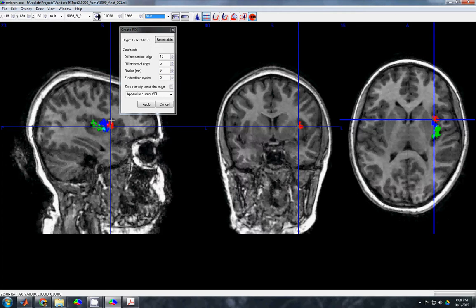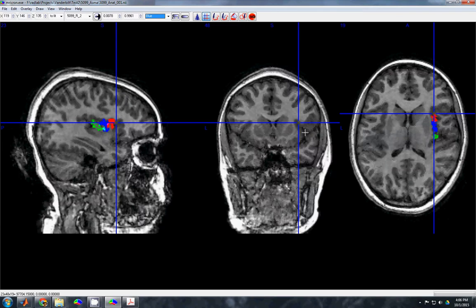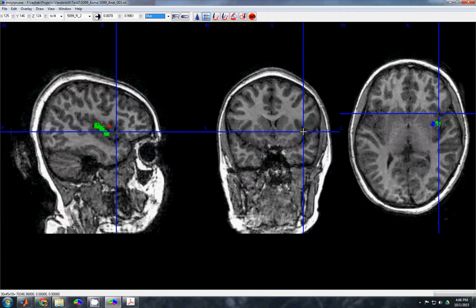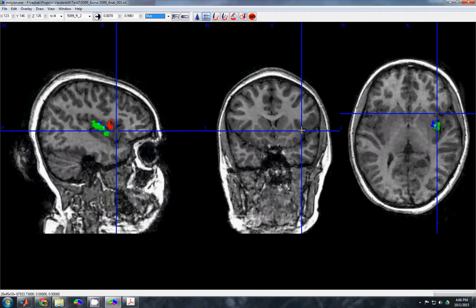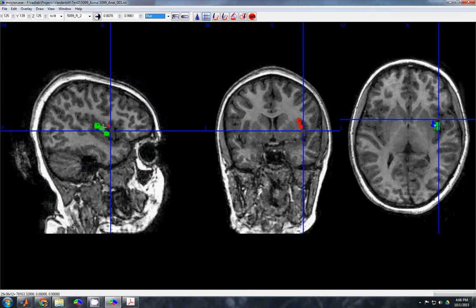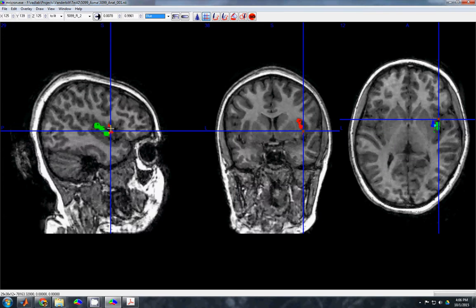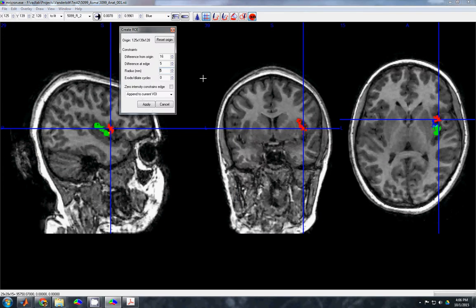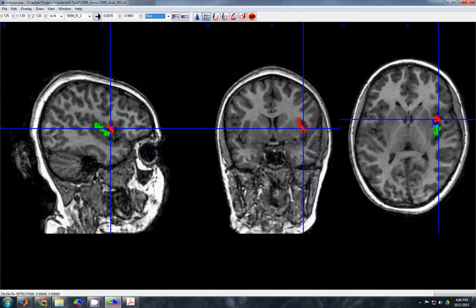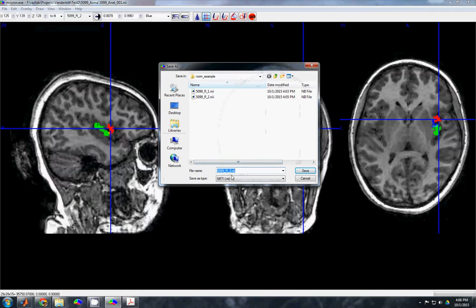Like maybe I want it to get the right cap up here, so I apply and then again. Oh, that's nice. And then I scroll out a bit too, so I'm going to move out towards the surface. I can see I haven't really done a great job of covering the very surface here. So even though region 2 didn't really come out this far, region 3 does. So I want to give it a fighting chance here. Good, so that looks pretty good. I'm going to save that one as region 3.